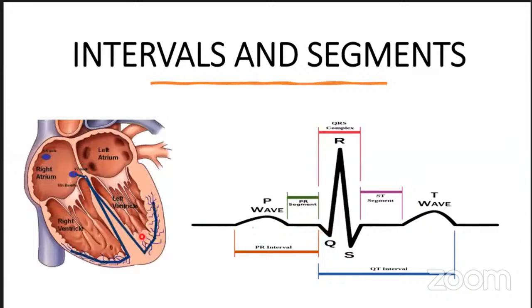And then we are going to have major ventricular depolarization, which is going to give us our R wave. And then we're going to have the final one, which is the basal depolarization, which is going to give you the S wave. But again, you can leave all of that and just know that all of the QRS complex, the Q wave, the R wave, the S wave, all of it represents ventricular depolarization. All of it represents ventricular contraction.